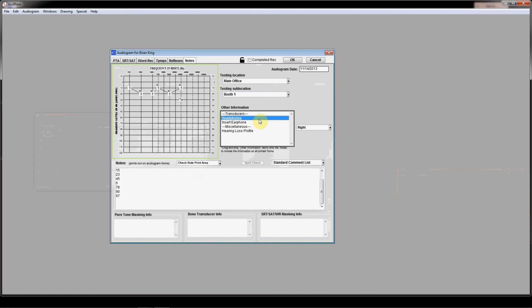We did keep that. But what we allow in this version now is if you did record something there, A, this is searchable, B, you're now able to click and drag this down into your notes field if you want to. So we do give you that added functionality, and if that's something you're interested in implementing, then we can work with you on that.